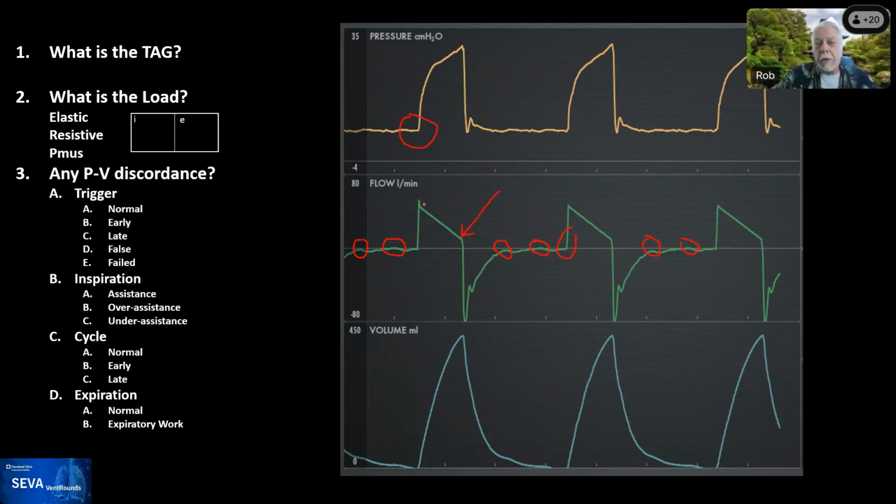I don't know why some people change the end inspiratory flow from 0 to anything above 0. It doesn't make any sense to me. But the point is, because you still have flow at this point in time, then this pressure no longer represents plateau pressure, right? Because if you were to drop the flow, the pressure would drop and we would see a plateau pressure like that if you extended a short period of 0 flow.